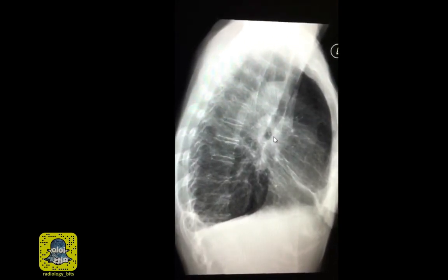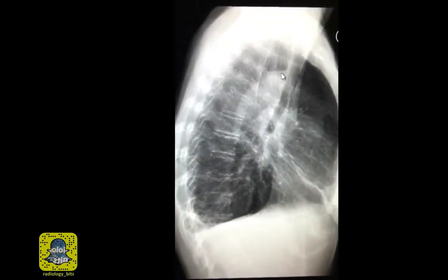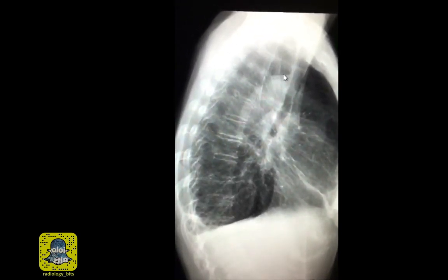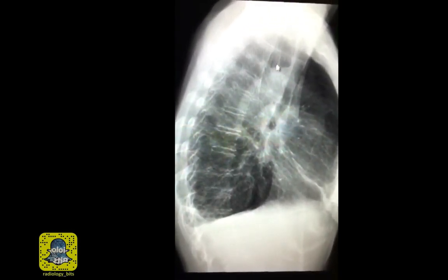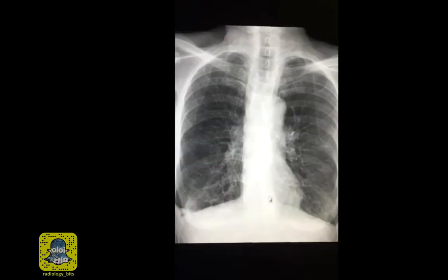We also learned that some abnormalities are difficult to see on one view, and that's why a lateral chest radiograph is very useful. A major consideration for a fluid level behind the trachea is that of a dilated esophagus. With a dilated esophagus, one of the differential diagnostic possibilities would be that of an obstructive lesion in an adult. Make sure it's not esophageal cancer.